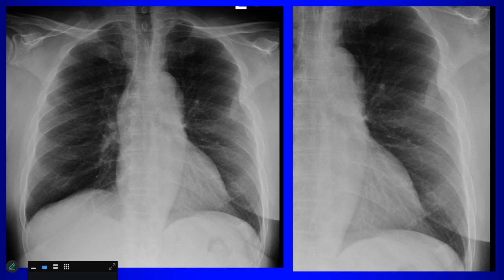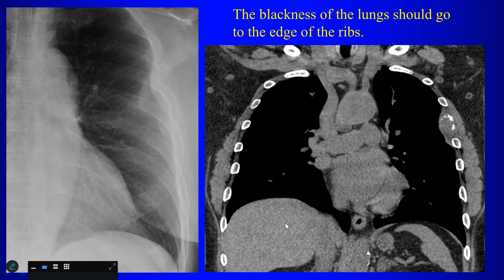How about we look at other things besides the hilum? Is it the AP window? It's maybe a little bit of bulging convexity. Nothing? Rib fracture? No rib fracture. Really? Oh, come on. That rib's destroyed. There's a tumor here.